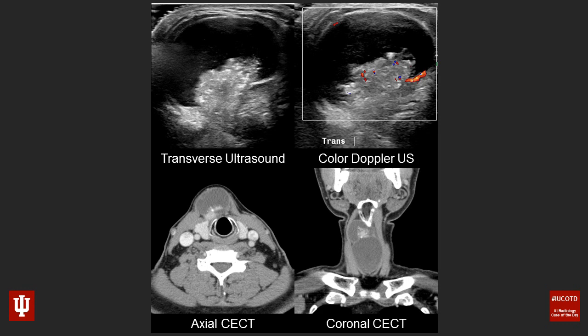So keep in mind the history. The patient was in their early 40s and they had a neck mass. Take a look at these images, try to figure out what you think is going on here.